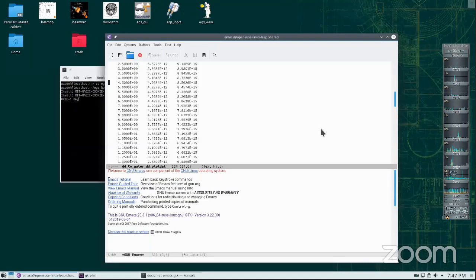Okay. So don't think that when you run more simulations, the dose is going to grow. It will not grow because everything is then normalized to the number of incident particles. You want to actually increase the number of incident particles so that you reduce this uncertainty. Now, in this case, my uncertainty is about 0.1%, which is fine, okay?